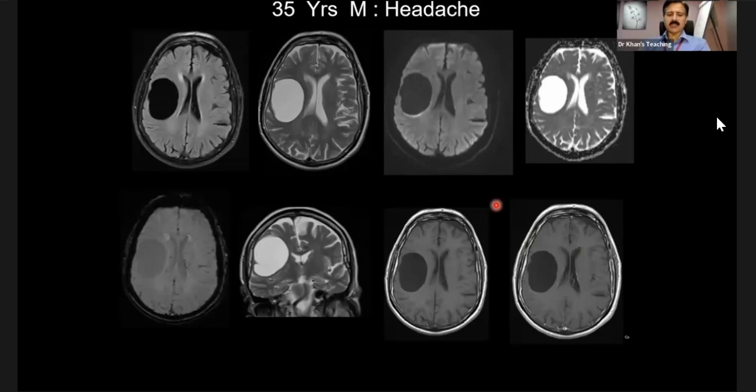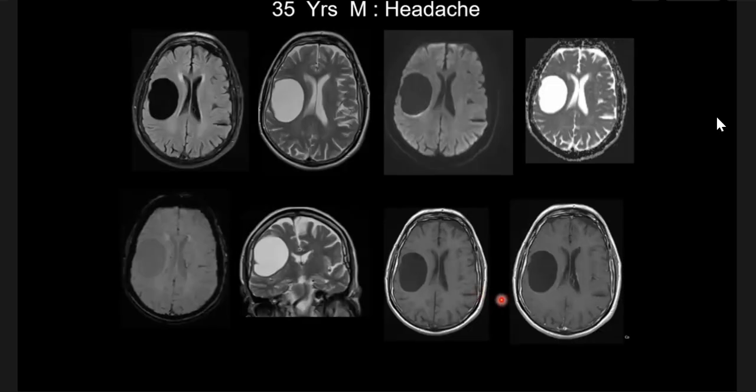A porencephalic cyst is a cyst where there was basically a previous brain insult, such as infarction, surgery or trauma, etc. There was nothing like this in this case. Basically, this is the differential diagnosis of an intraparenchymal cyst. So your thinking is right, but I'm not satisfied because I knew the clinical history. So over to you. Given the patient has headache, I'm thinking this lesion is related to the symptoms.